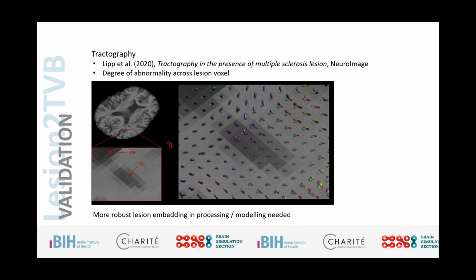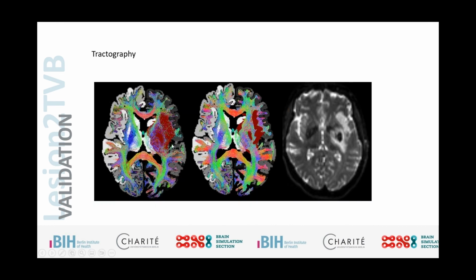So setting this to 0 might artificially, again, inflate differences that we have because we're excluding information which is actually still there. And we see this if we perform tractography including the lesion mask here, as we said, so we don't keep any traces that go through here. If we do not do this, our pipeline enabled us to select the embedding mode of the lesion. And we could also say, do not include the lesion mask as pathological tissue, but rather just track everything that goes through as if it was healthy signal.